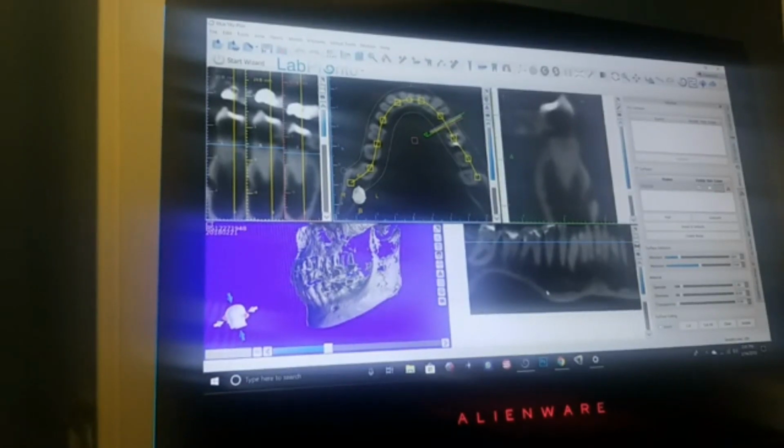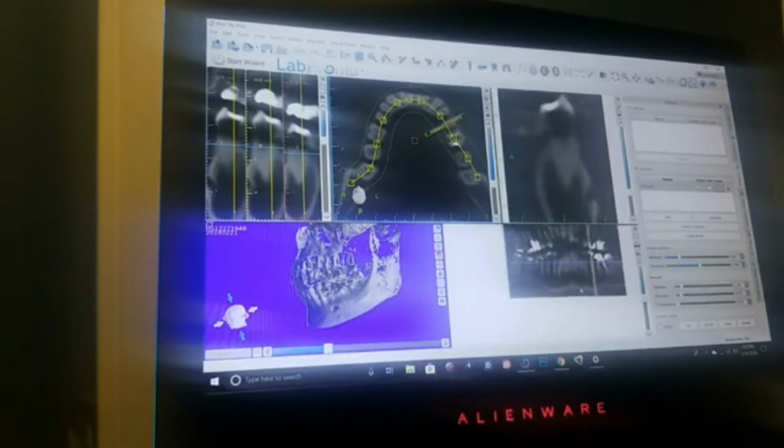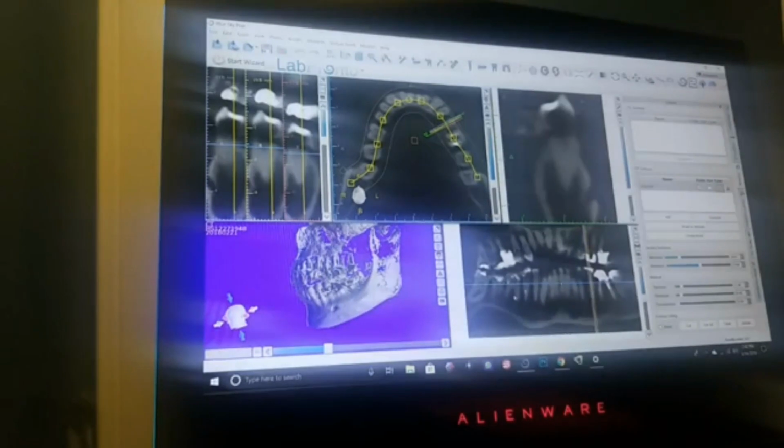Sometimes it's not so easy, because in some areas patients are missing bone in the lingual and there's a dip in the lingual, or there's too much bone and the patient has maybe a class 3 skeletal malocclusion or something. So it's harder for you to see your most anterior area and most posterior area in the mandible due to the anatomy of the mandible. But in this particular case, we have a very good, straightforward kind of mandible.